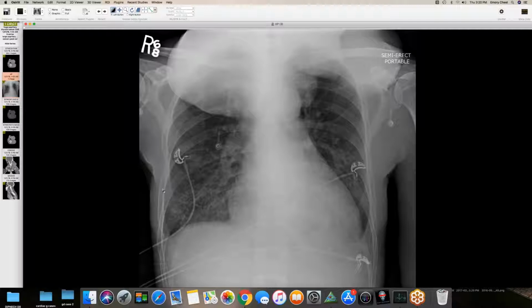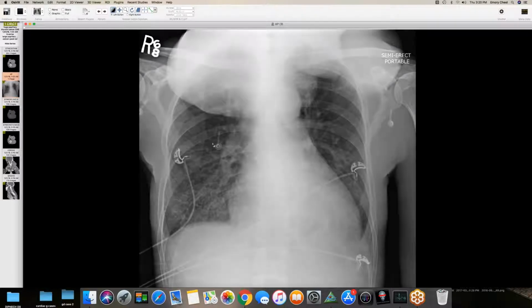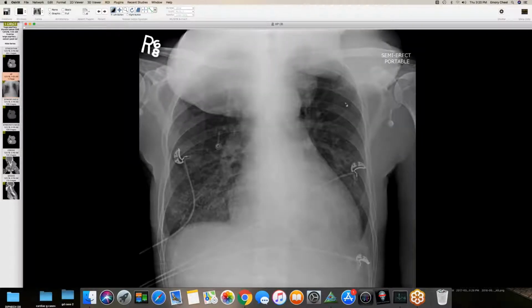What's going on here? Weird folding of some tissue, but just a very lobulated, large mass sitting up here over the neck and upper chest. You can tell it's not arising from the lung itself, and you can see nice vessels through it, and the lung and mediastinal contours are not silhouetted here.